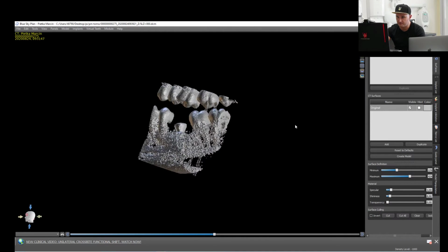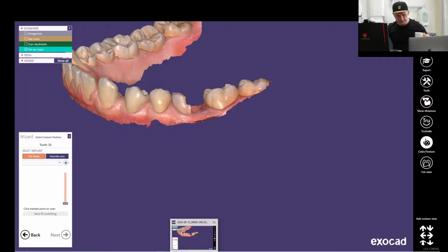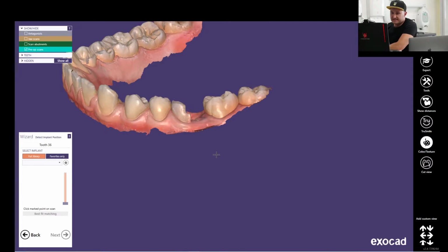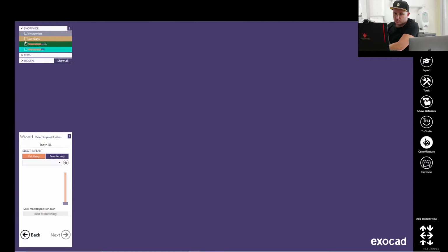also on the 3D image. And after it healed, which was approximately 3 months, we decided to go with designing the restoration. So this is how it is. And here we go.